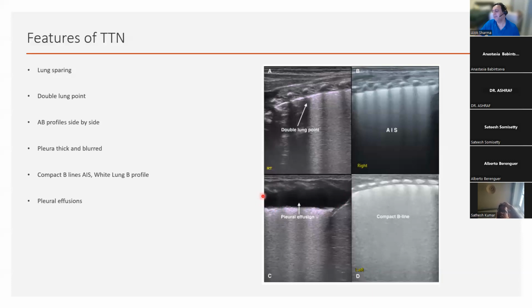So my personal view is I don't use the word hydrothorax, because it's a very vague terminology. I know that they're used interchangeably, at least in the UK. But what I'd say is that pleural effusion would be fluid between the visceral and parietal pleura. And really what you'd be able to see is what you call a jellyfish sign.